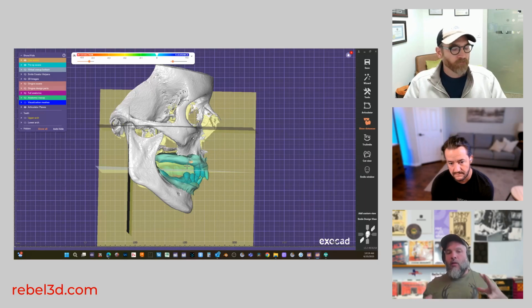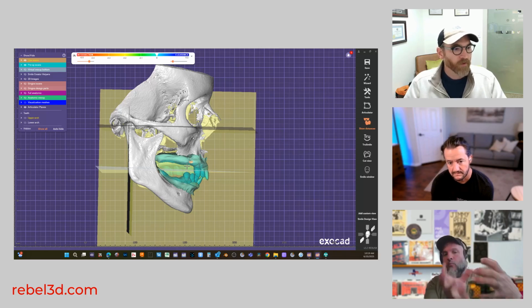And then that way we can say that your guess is much more accurate than mine, because mine is completely arbitrary. You at least have the patient there. You can move around and figure out where his jaw should go. And so that way you end up doing the part of the process that needs to be done on your end of things.